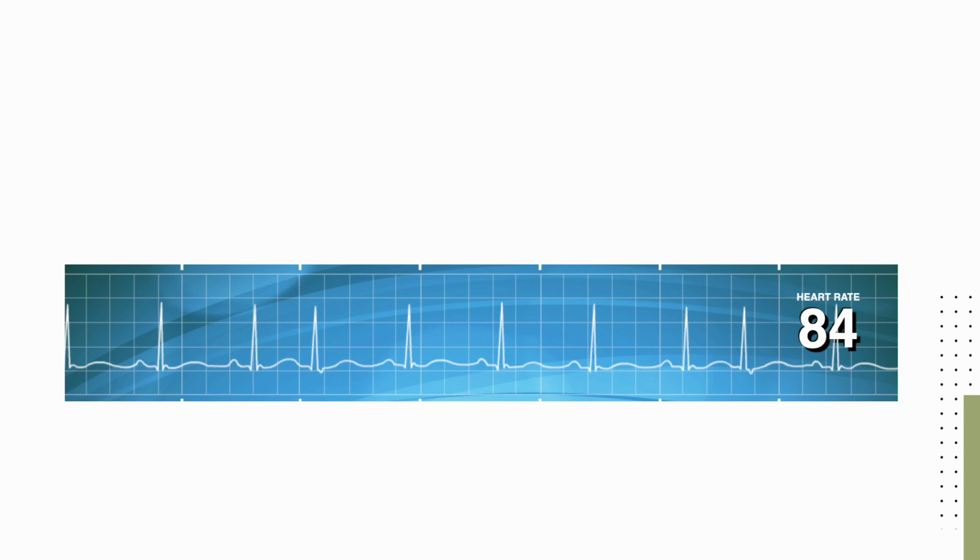This next rhythm is another example of an extrasystole, or a premature beat. As we can see, starting from left to right, there is a P, a QRS, and a somewhat flattened T wave. Then there appears to be a beat that happens earlier than it should. This is all about morphology. This beat has a narrow QRS complex with no P wave. So, which one of our three areas of the heart does that seem like it's coming from? This will be area 2, the junctional area. So this rhythm is a normal sinus rhythm with premature junctional contractions, or PJCs.